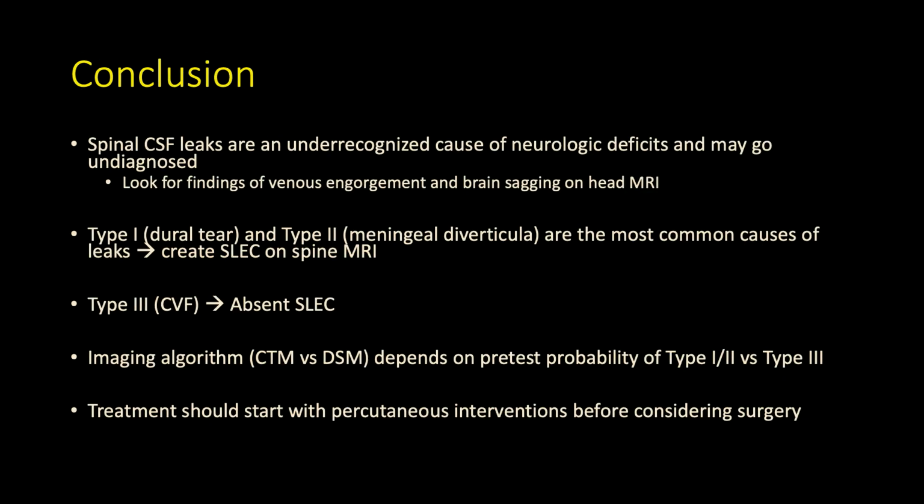So in conclusion, spinal CSF leaks are a very under-recognized cause of neurologic deficits and may go underdiagnosed for sometimes years. And I'd like you to look for those findings of venous engorgement and brain sagging on any MRI you read for the indication of headache. You will find these patients out there.